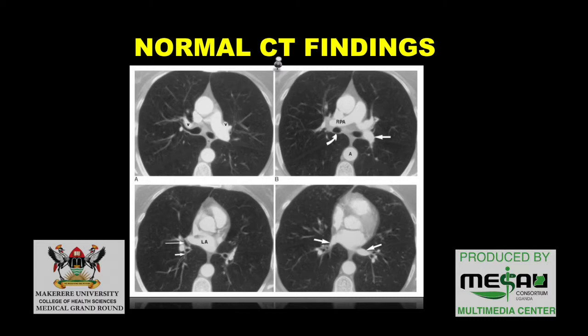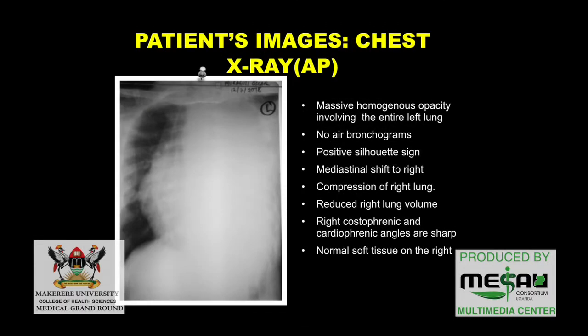Okay. And from the patient, this is the radiograph that we are able to appreciate. My colleague tried to display it, but it was a little bit not clear. And I think we can all appreciate from our first anatomy that actually there is a problem with this chest X-ray. What was dark initially, what we call radiolucent, is actually bright. It is opacification of the left lung. And then on the right, you can see some bit of radiolucency, which is the right lung. This is our left lung.